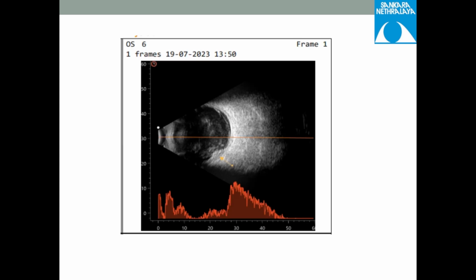Yeah, describe this. This scan is actually not passing through the clump echo inferiorly, but the vitreous cavity shows a few dot and clump echoes with a homogeneous moderately reflective, might be a clump echo inferiorly, with isohomogeneity. Is it a clump echo or? It is a mass lesion, a suspected mass lesion.